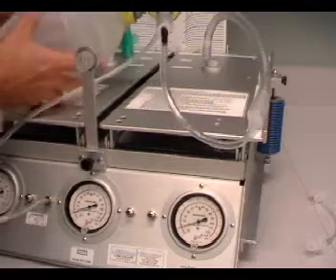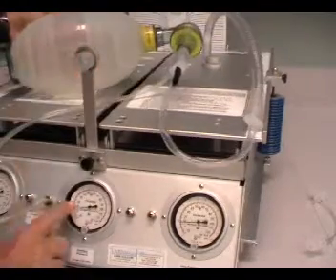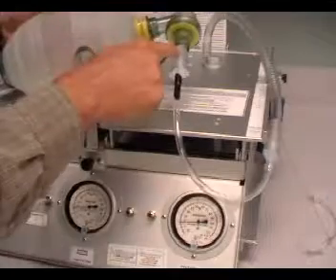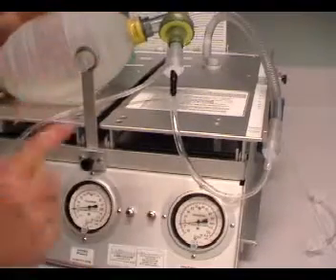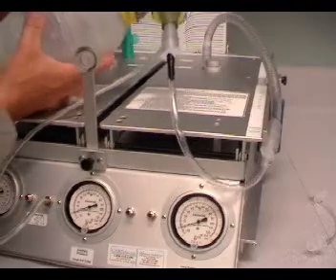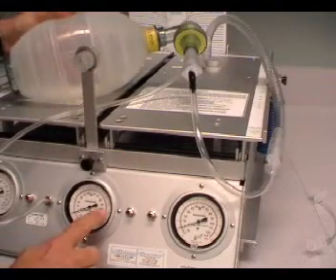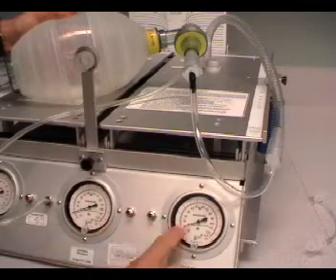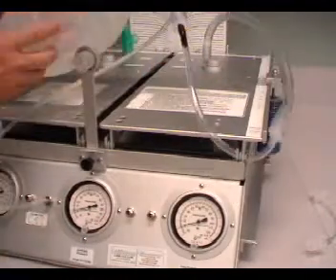So as I'm forcing air into the test lung, you'll notice that this pressure gauge here, which is measuring the force of the pressures right here at the mouth, and this pressure are different. Initially, while there's flow, as I'm pushing the air in, you'll notice that this gauge goes quite high, above 100 centimeters of water pressure, where this gauge slowly builds up until the pressures in the lung equal these pressures here.